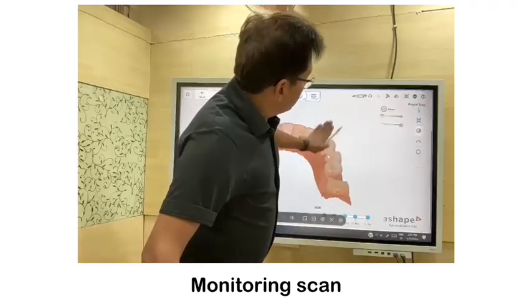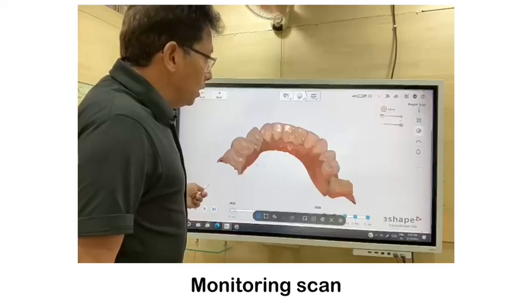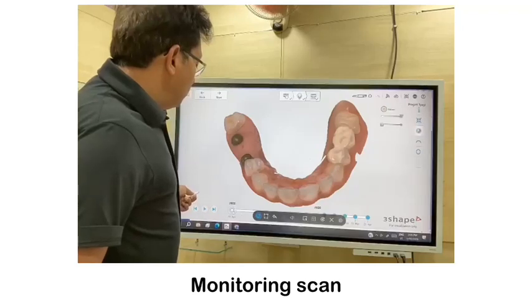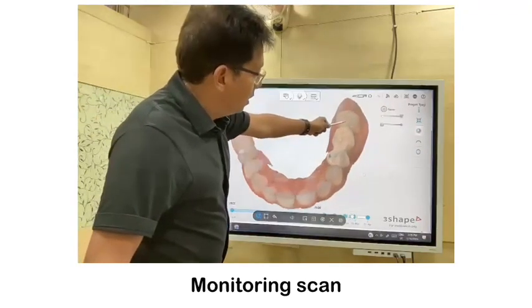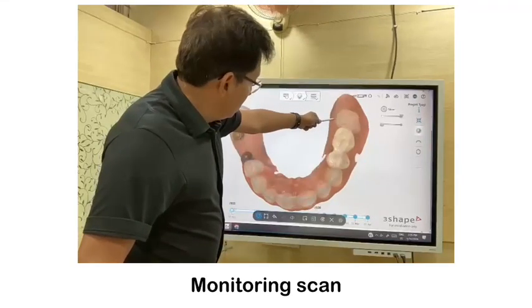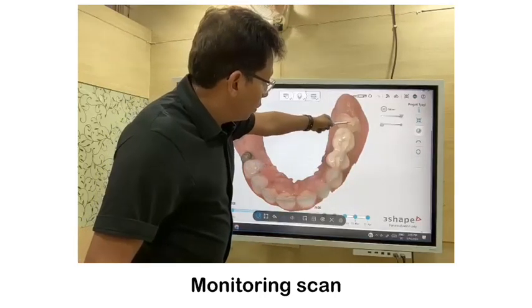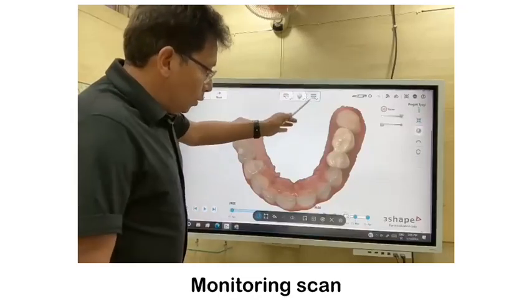With canines, composite against composite runs, and occlusal pressure is distributed. This is the lower, this is the upper. I'll show you here. Upper, this is the original, and this is the final. We rebuilt it. This is the only onlay. We didn't grind the tooth. You can see here. The old onlay was removed and a new onlay was placed because occlusion had to be balanced.